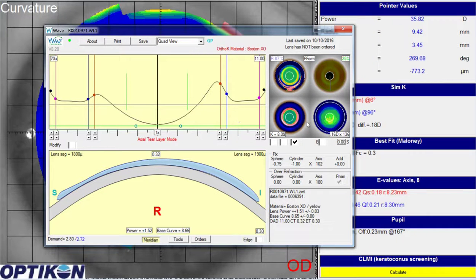So because this is such a spherical cornea and there aren't any anatomical markers to really orient this lens, at least when the lens is first put on in the morning or in the evening, it will hopefully orient the way we want it to, because if this lens does rotate 90 degrees, then we're actually going to cause more against the rule astigmatism instead of with the rule, and that will work against us. So this is going to be a little bit tricky because once the patient lies down and posture is different, where is that prism ballast going to go? We don't really know, but this does give us a way to orient the lens when it's applied.